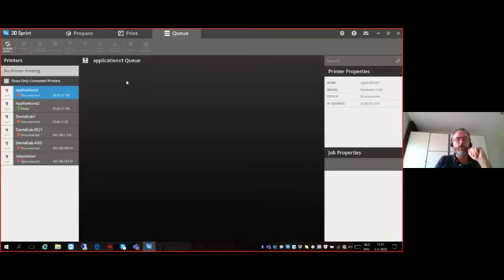So you can also control here by these faded out buttons at this moment the order of printing. So if you have selected something to print, but for whatever reason you need to change the order because the dentist made a mistake and the patient is not coming tomorrow but today, you can do this here. You can print that particular model faster or first.